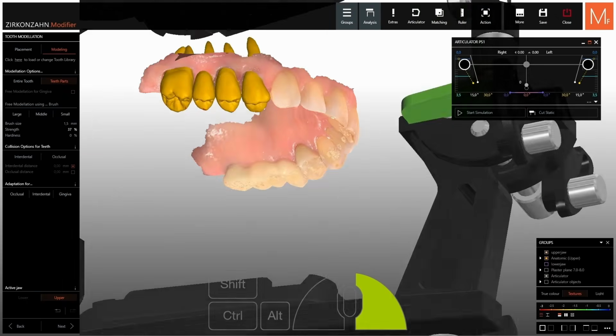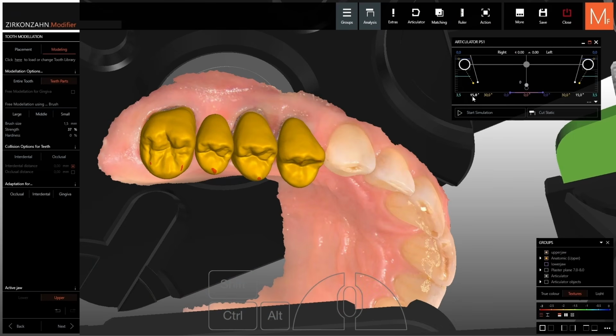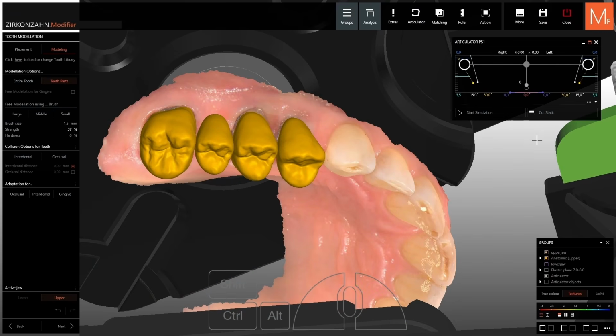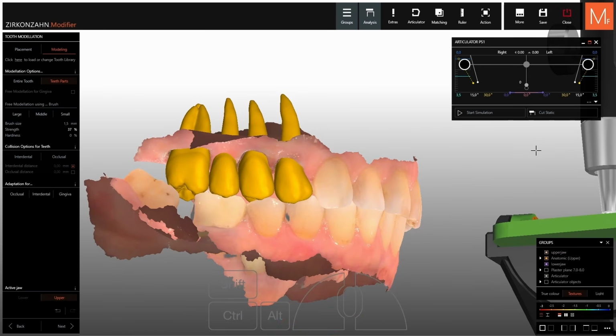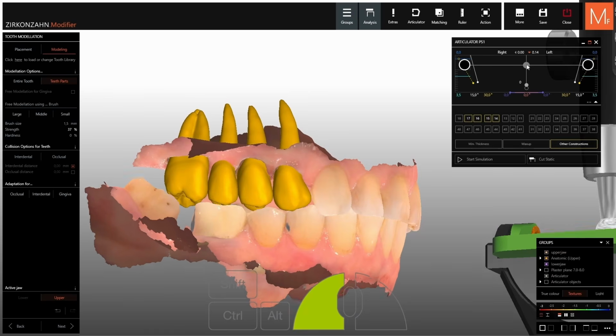The first step is always to cut static intrusions by clicking on Cut Static. After that, we can also include our designed teeth in the movement. We cut the intrusions first since the software would otherwise open the articulator pin. If we click on the white little arrow, we can incorporate the teeth into the collision group for the antagonist as well. The teeth are now influencing the articulator movement.